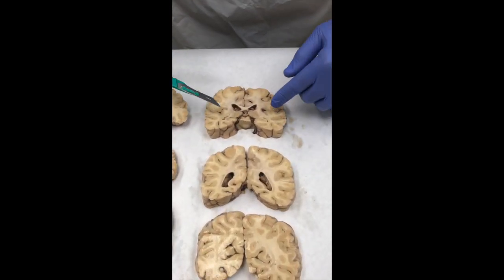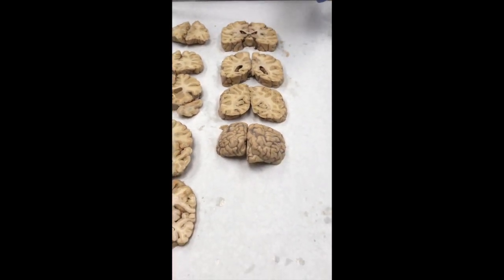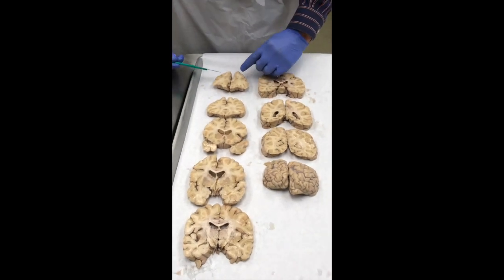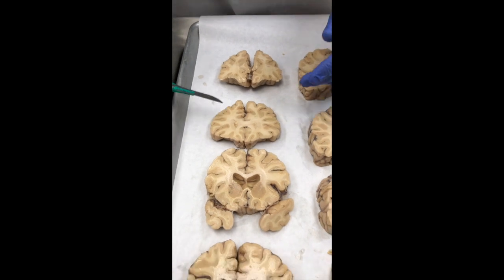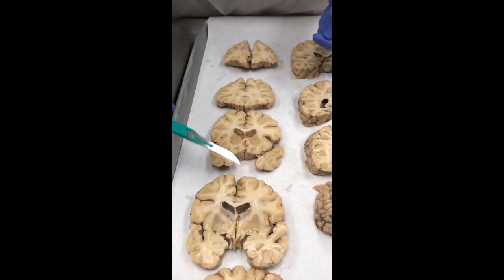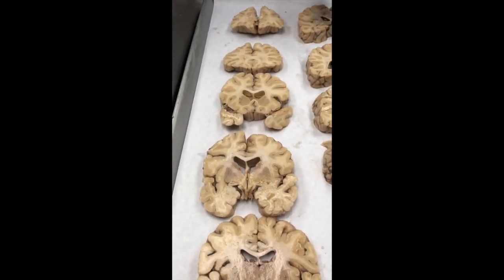Here again, the cortical ribbon looks entirely intact without evidence of infarcts, which again would be expected in the depths of the sulci. Next structure to look at is the white matter, just underneath the cortical gray strip, and you can see that it's uniform in its appearance. We don't see any evidence of plaques like you might identify in multiple sclerosis. It's instead just a uniform white character separating the deep gray nuclei.